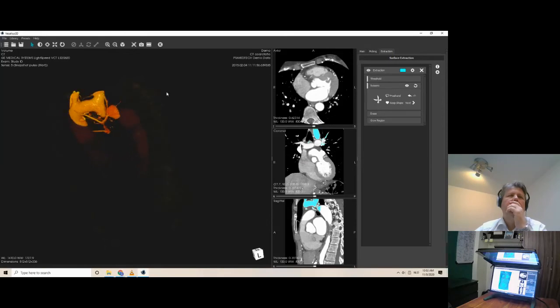So, say this is what I want to keep. Then I move to the next stage. Now I'm in the erase section. In the erase section, you see this blue ball, which you can use to erase stuff. Just going over the panel, you can change the size of the ball, you can make it big, you can make it small, just to finalize the elements you want to print.